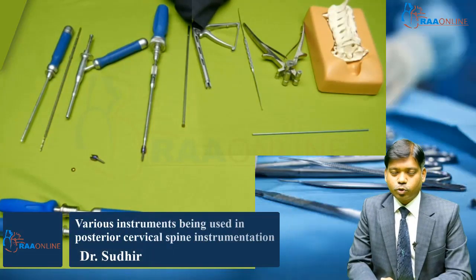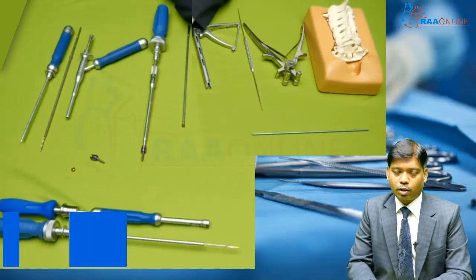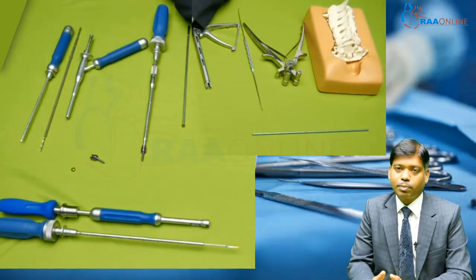Hello everybody. So in this module we'll be looking at and discussing the various instruments which are being used for posterior cervical spine instrumentation. Posterior cervical spine surgeries are not very common surgeries, and the commonest etiology for which they are being performed is cervical myelopathy, especially multi-level cervical myelopathy.